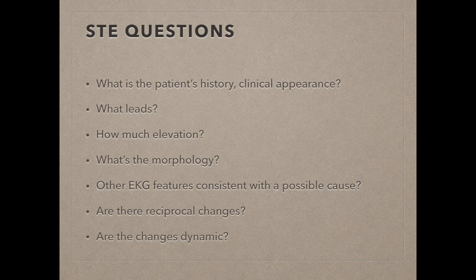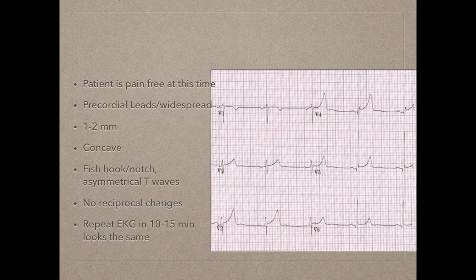Well, we've already answered that. No. Are there reciprocal changes? In other words, is there ST depression in some of the other leads while we have ST elevation in others? And last but not least, are the changes dynamic? Do they change over time? Well, here it is.